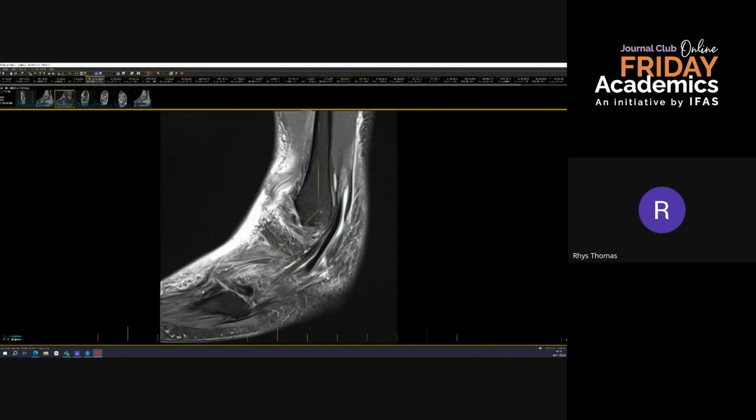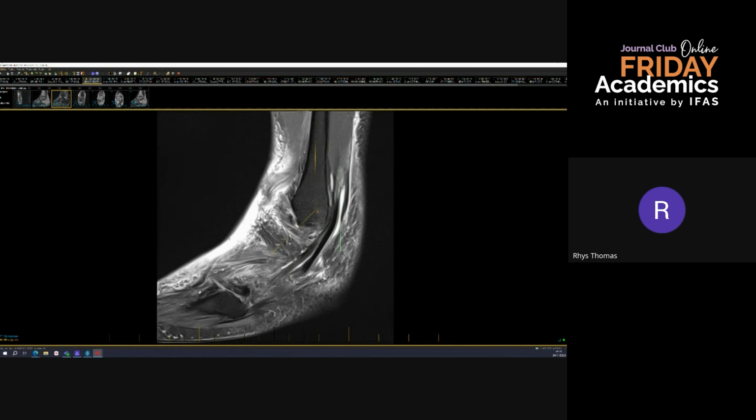You can see when the peroneal tendon goes at this angle, it starts to become hyperintense, and that's where we get difficulty on PD FATSAT to see whether this is real brightness or an artifact. One of the reasons we do a T2 FATSAT in our institution in Cardiff is to minimize this artifact so we can be a bit more definitive whenever we call it.